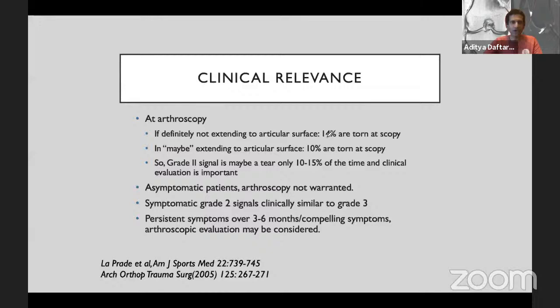And this transverse intermeniscal ligament, if you draw a line sort of at the junction of that transverse intermeniscal ligament and the anterior horn of the meniscus, what you end up seeing is this little flap-like structure here, which is essentially this little ligament we are seeing. So that is one reason you can mistake anterior horn medial and lateral meniscal tears. And we know that isolated anterior horn medial and lateral meniscal tears are unusual. So if you see somebody reporting them, and if you see one MRI center reporting them very regularly, then you know that that's not something that they are looking at very carefully.